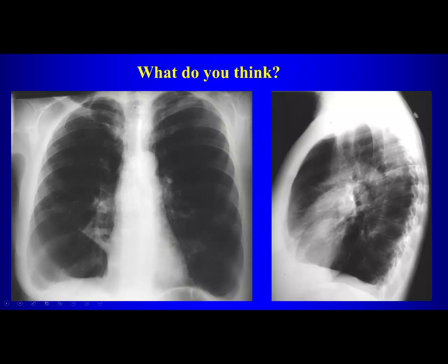Now here's a PA and lateral chest radiograph. What's abnormal? When you look at these radiographs, is this normal or abnormal? No, it looks abnormal. So tell me, what looks abnormal on the chest radiograph?